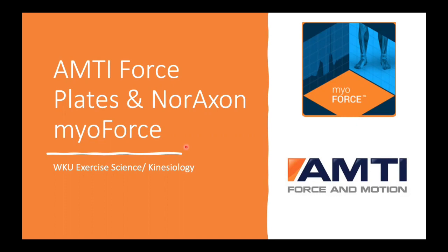Before we get started, like I mentioned previously, we're going to be using two different pieces of software. We're going to be using the AMTI force plates, and we're going to be interpreting the results on the MyoForce platform. The lecture will be together, but there are two main parts while I go through and talk about how to use these pieces of software.